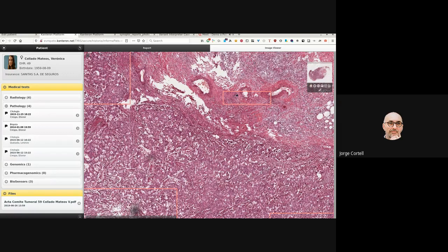Anyways, here you can see regions of interest. You can create annotations here. You just move it to the area where you want to make an annotation, and we can have here test 55, and I have no idea, and you mark here if this is from a red cell, from a band, neutrophil, whatever. So you tag it, and then you save it, and then this has been saved as a region of interest, as an annotation.